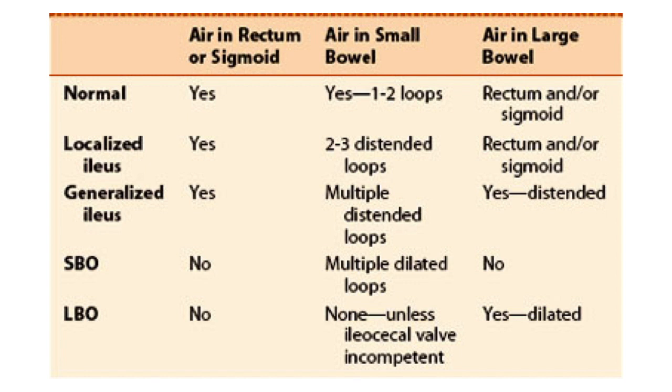If there is no gas in the rectum, we talk about mechanical obstruction, which could be a small or large bowel obstruction. Okay, so lateral decubitus is for that.